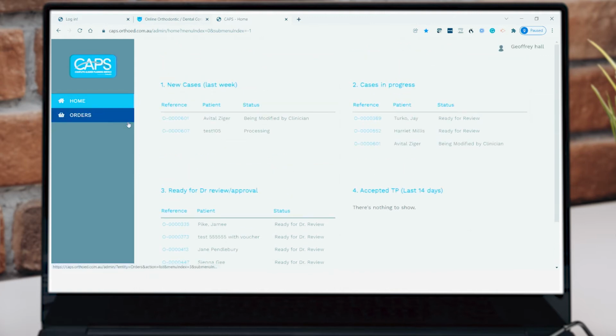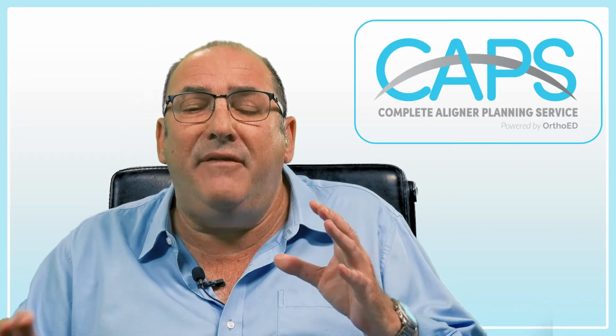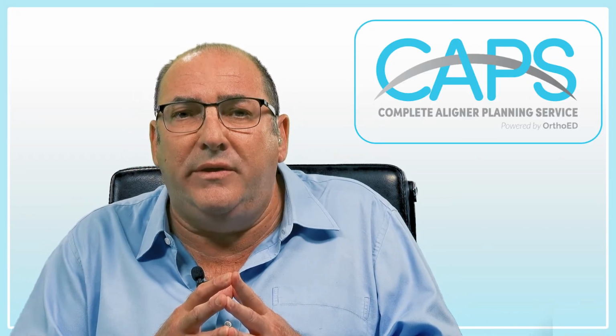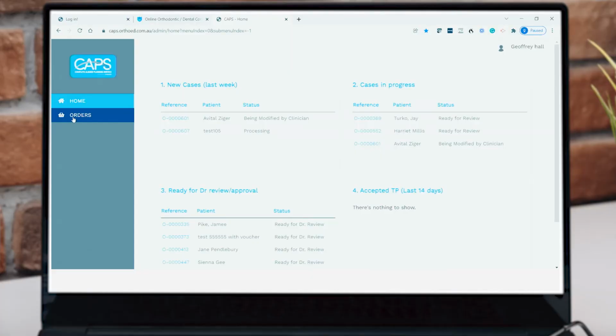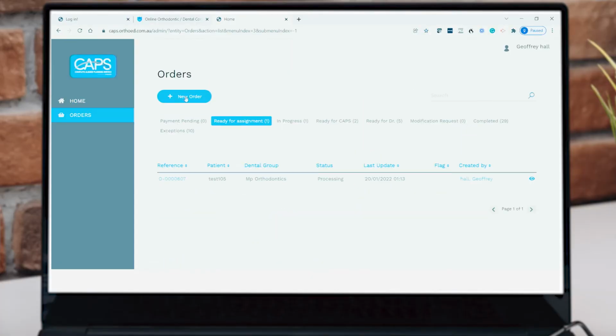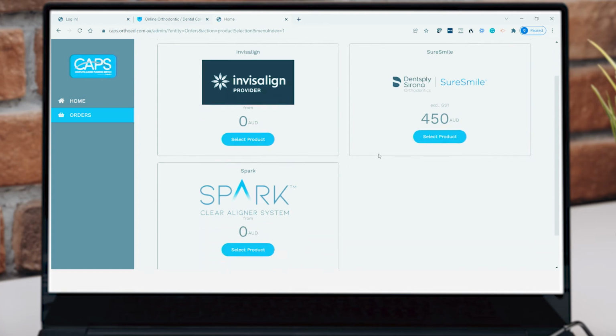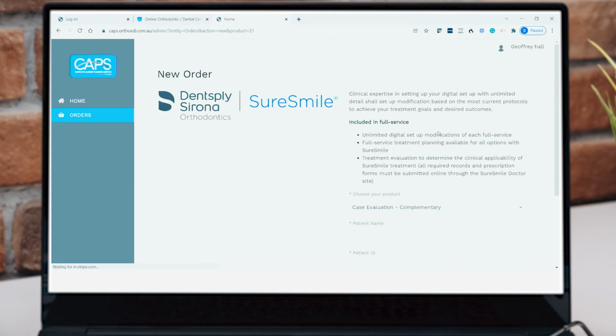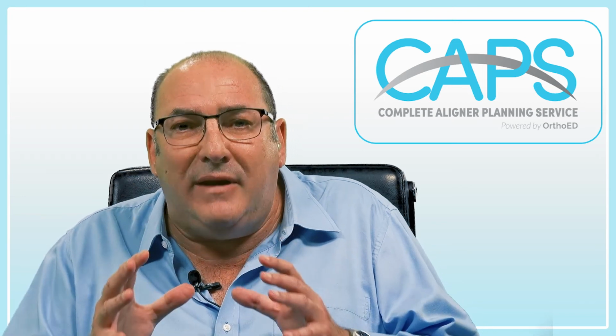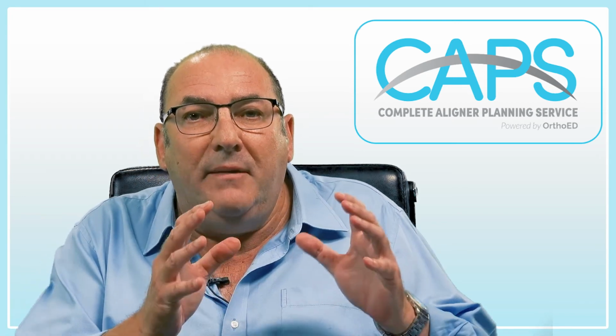Let's go back and show you a case that may have a non-umbrella agreement associated with it. In other words, there is a fee based on submission of the case. So here we are, we're going to do a new order again, and we'll do a SureSmile. I'll select the product, and you'll have all these different products that you can do, whether it's a comprehensive case, so let's do a SureSmile comprehensive. Remember that you will have to have added that patient onto the SureSmile portal first.